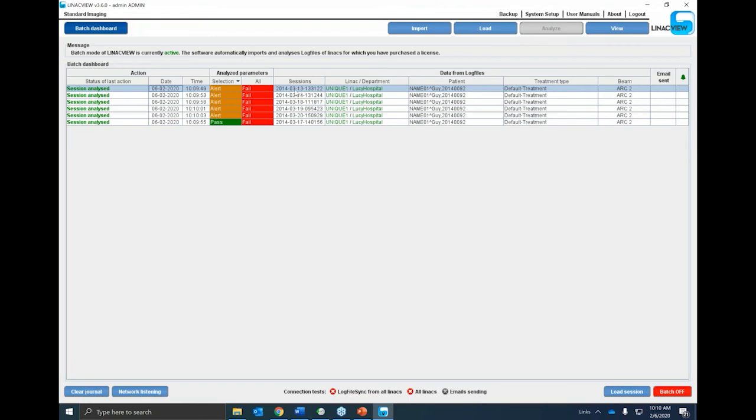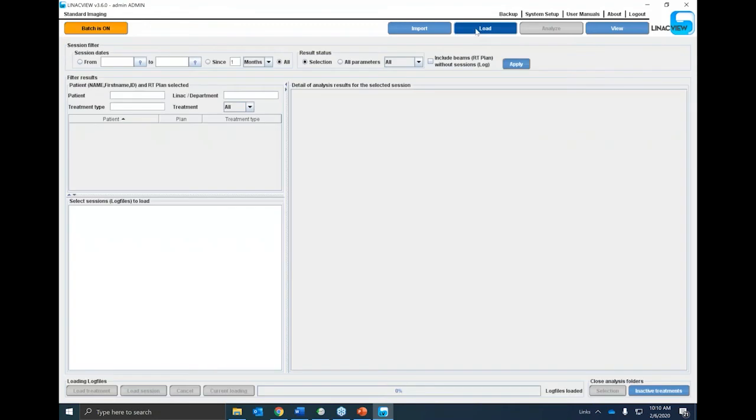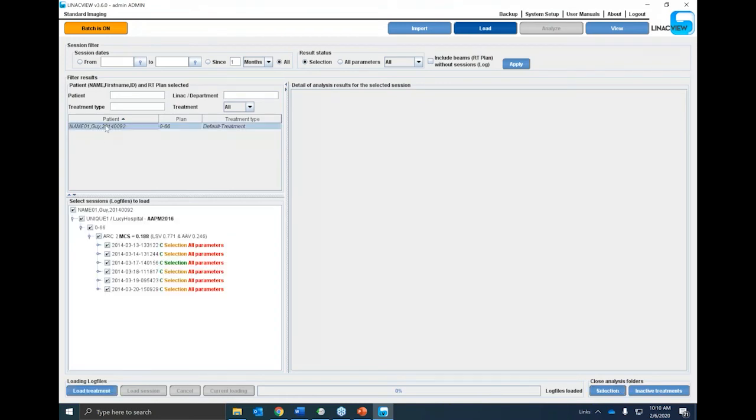I'll go ahead and load this particular session, the first one, and bring it in because we want to see what happened to this particular file.